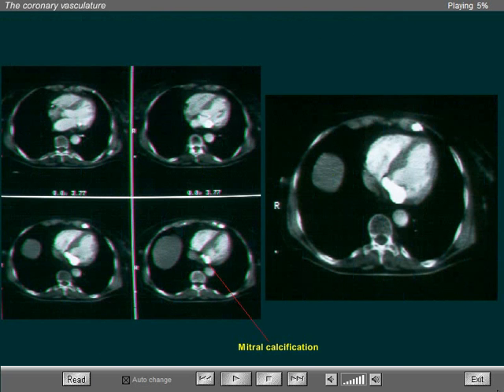These are two examples of heavily calcified mitral valves. Note the density that is quite extensive, indicative that the annulus of the valve was affected and the calcium infiltrated the muscle. Calcified mitral annulus are quite common in elderly individuals and most of the time are asymptomatic. However, we may see arrhythmias and even chest pain as a result of extensive calcifications that involve the myocardium.